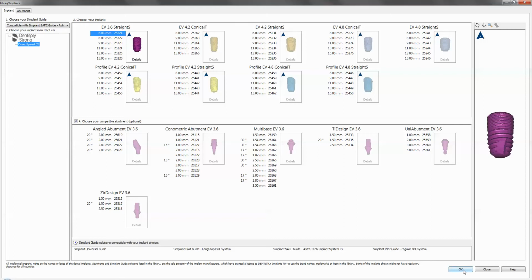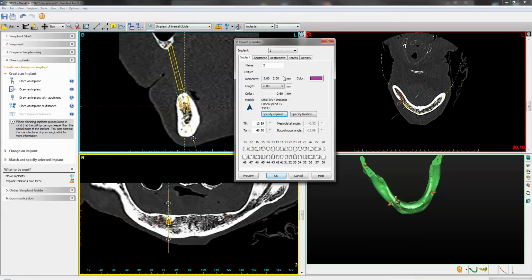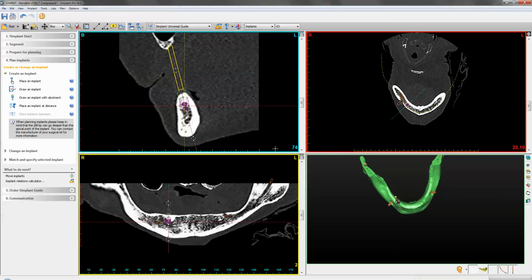Once you're happy with selecting your defaults, you click on OK. And also get into good habits and label your implants accordingly. So for this particular region, I will click on implant 4.3. Click on the tooth chart and then click on OK, and it labels the implant. Now that I've got my shortest implant, from here I can then determine what length I'd like to choose from. I would think an 11 mil would be alright, but again, this is up to you, and it's based on every specific case. Every case is different. You would have to assess every case on what length and what diameter is desirable for the patient.